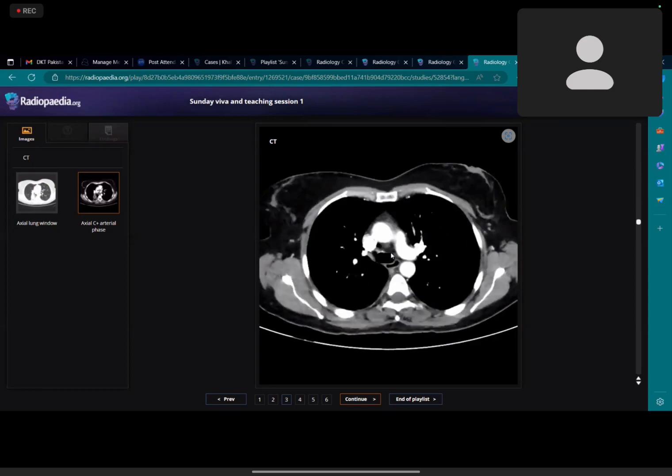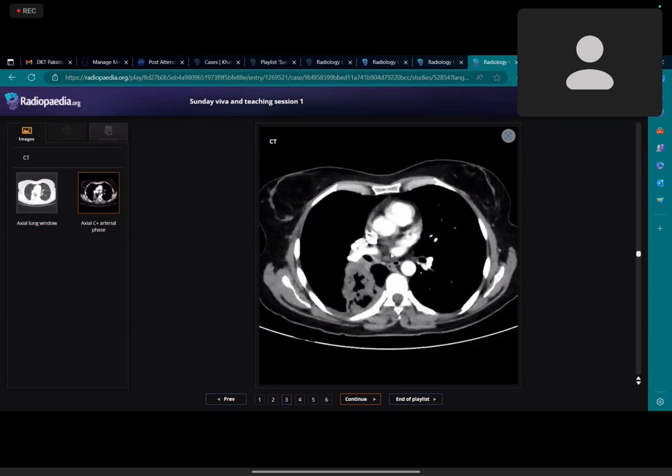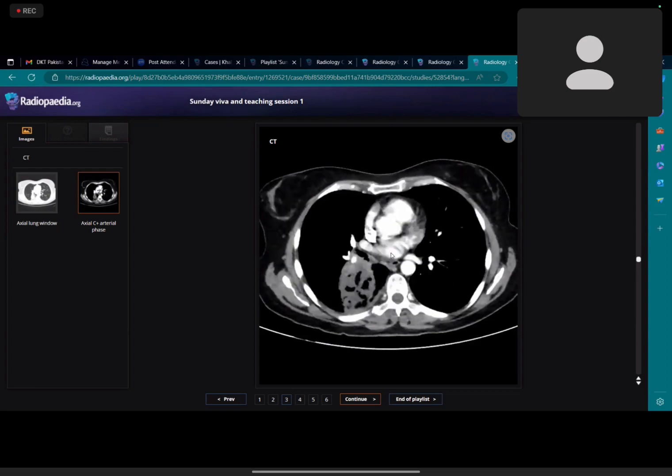In summary, it's a right-sided hilar mass with an associated cavitary pulmonary lung lesion. It looks like a malignant pathology. I will inform my findings to the clinician and would arrange a staging CT for this patient. I would refer this patient to MDT after staging, and if this patient is amenable to endobronchial biopsy, I would arrange an endobronchial biopsy after MDT.